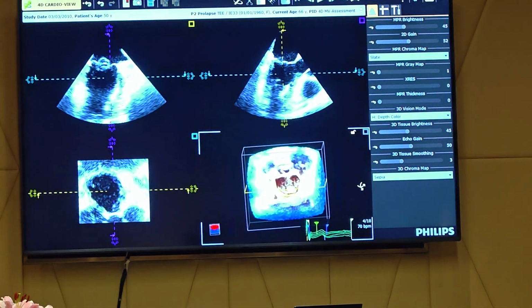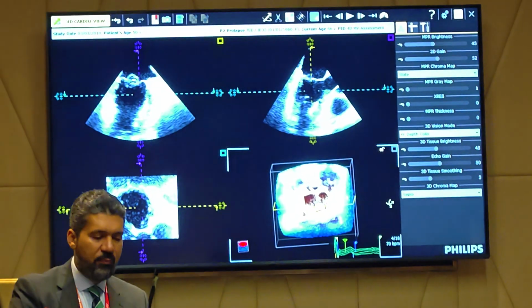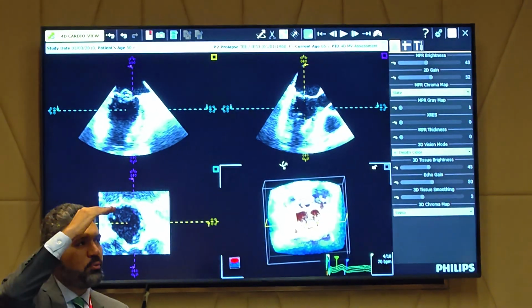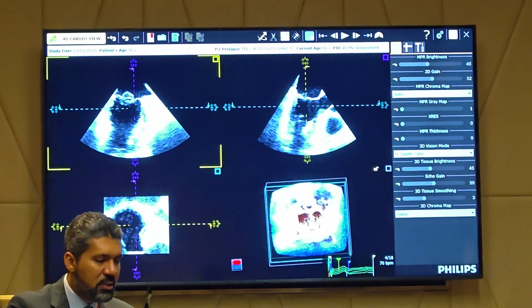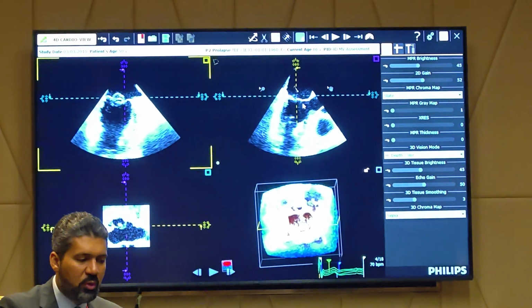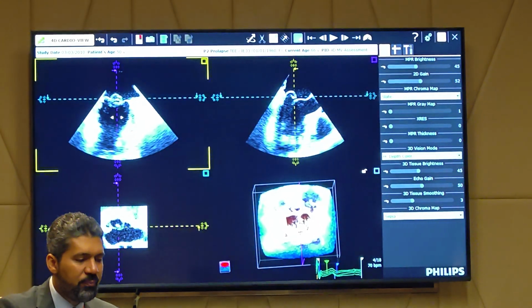What the? How did you get there? Mitral annulus. Do you remember the tool for automated quantification? The blue line was just above the annulus. Do you remember that? So we need to bring the blue line just above the annulus, like that. And that one also above the annulus. And the purple line just in the middle of the annulus also.